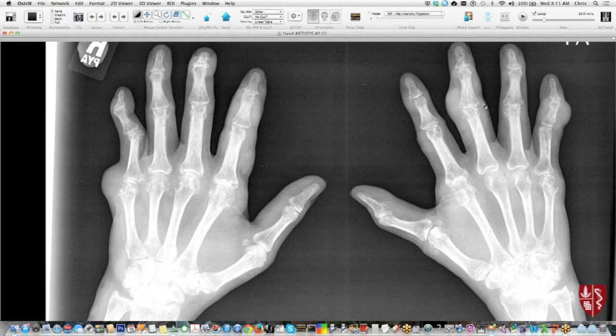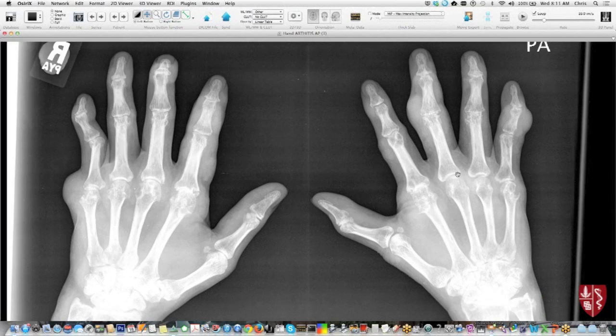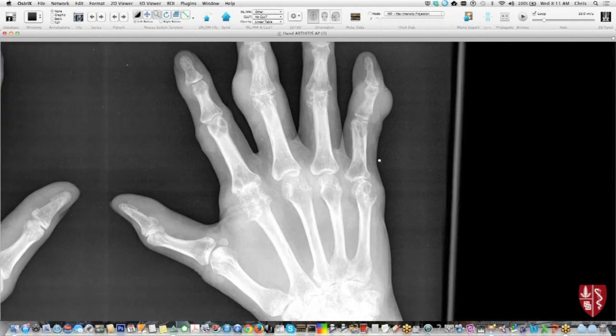What that makes me immediately think of is two things. One is, could they be rheumatoid nodules? But the other thing is, how about gout, right? Because you get gouty tophi. So gout is another thing that's inflammatory. It's not infectious, but it's a crystal arthropathy, right? And we talk about the protean manifestations of that. Let's look at the right hand in more detail here.